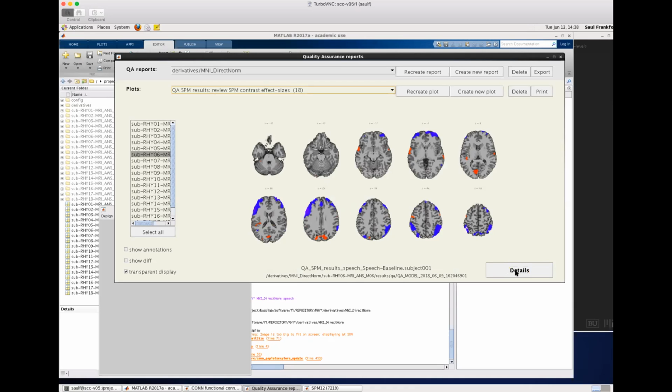So basically at the borders, there are very large signal changes that just covary with the actual motion. When a person is moving from back to front, then you see a lot of pseudo activation in the front areas and back areas, because that is where most of the BOLD signal is changing. And when the person is moving from left to right, then you see pseudo activations in the left border and the right border, because those are the places where the BOLD signal is changing a lot in covariation with motion.